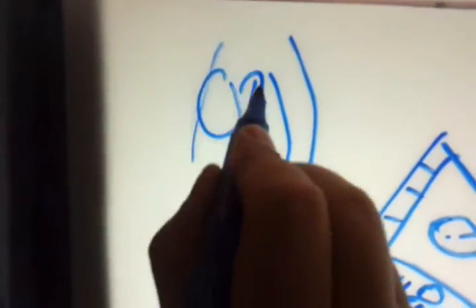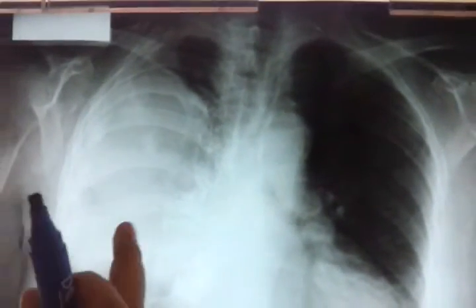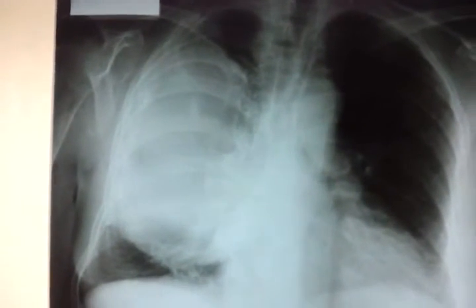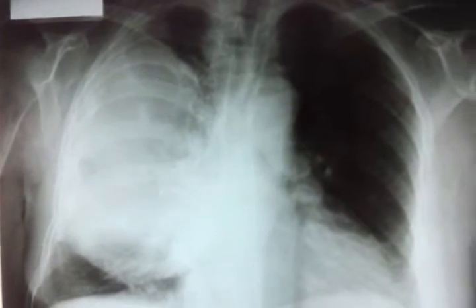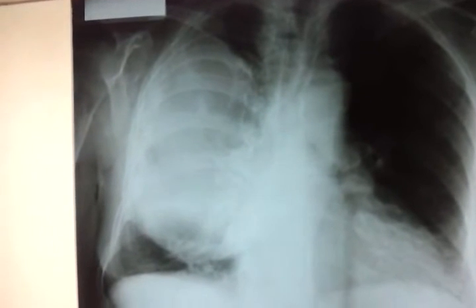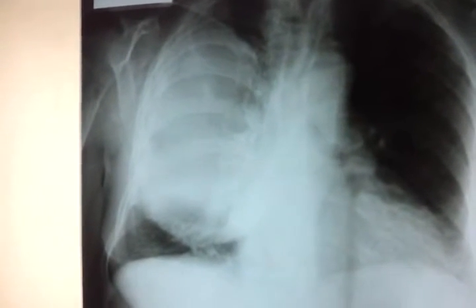If you see a big central mass with mediastinal enlargement, just like this, this is a mass and there is enlargement of the mediastinum. Wide mediastinum, this is small cell carcinoma, and usually small cell carcinoma doesn't cavitate, and usually there is no clubbing and no cavitation. Therefore, most probably this lady got what? Squamous cell carcinoma. What other differential diagnosis might there be? Because the history dates back 1.5 years. You know the doubling time of squamous cell carcinoma is what?